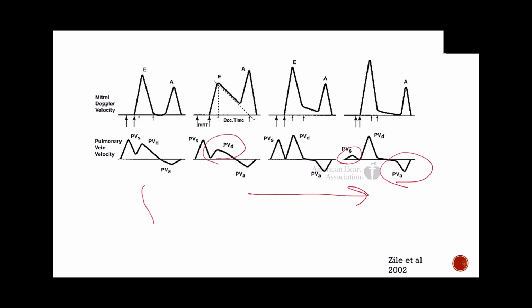So if we look at, so these are our veins, this is our left ventricle, this is our left atrium. As we progress and have a very thick left ventricle, right, and a very strong high pressure left atrium, it's going to try to push blood forward, and some blood is going to go forward. However, we're going to notice that the pressure in your veins is less, and so a lot of the flow is going to go retrograde here, and so we have a higher and longer AR signal. Okay?